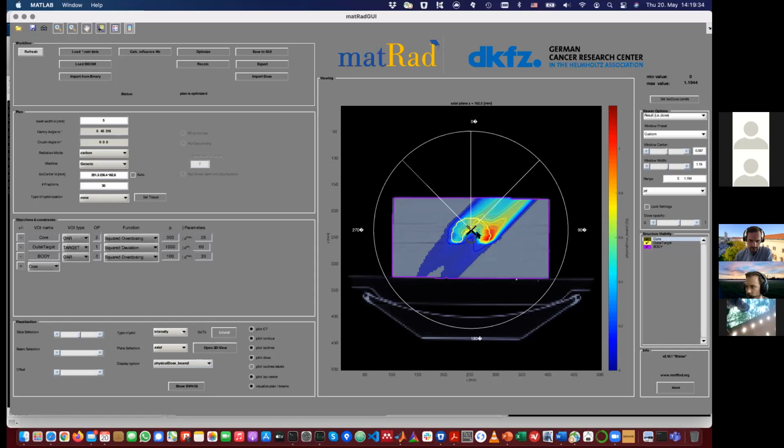If you compare this to the proton treatment plan, we should now have a higher dose in our organ at risk because of the dose tail, and the dose tail is always there. It cannot magically disappear. All right, then I'll switch back to the physical dose.